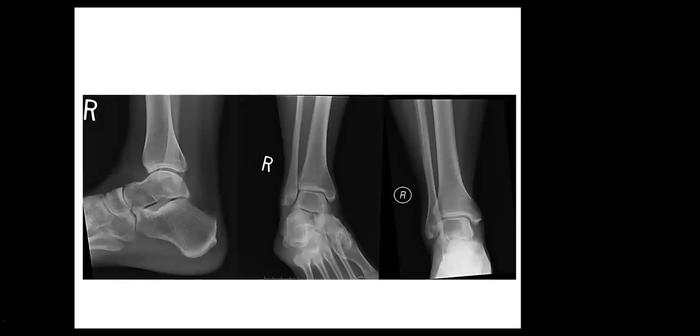The reason I ask for more description on the radiographs is because of the way to describe this lesion. You would normally say there is a subarticular lytic lesion in the talus with narrow zone of transition, no collapse of the articular surface, no periosteal reaction, no extraosseous mass. Remember from the bone tumor talk, we talked about radiographic description of bony lesions.